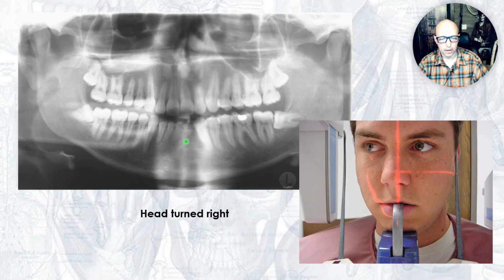I want to talk a little bit about the anterior mandibular teeth here. Why do these roots disappear? Have you seen that before in panos? And what's causing that? That's the focal trough, right? Why are those anterior teeth roots outside of the focal trough? A lot of people have flared anterior incisors. If you think of the maxillary incisors, a mandibular like this.